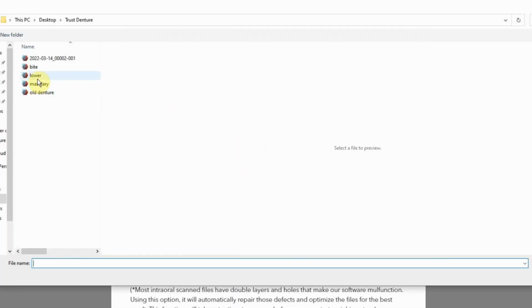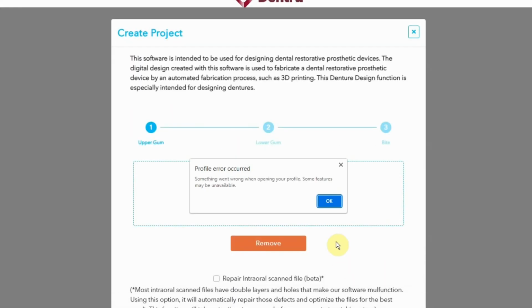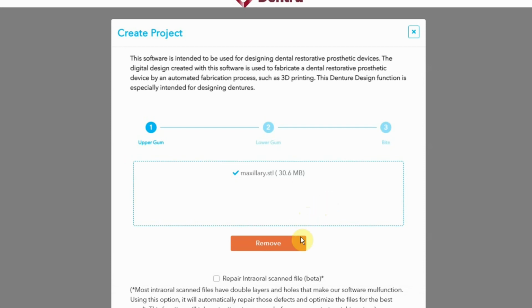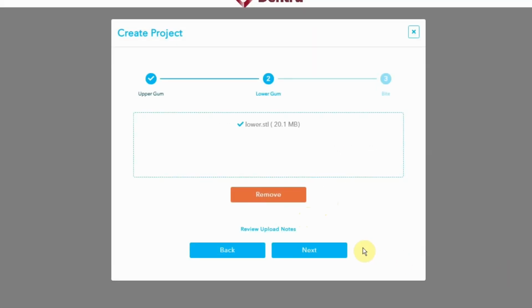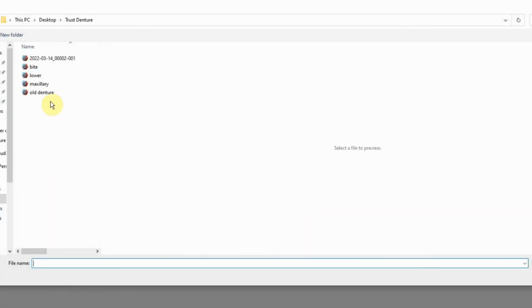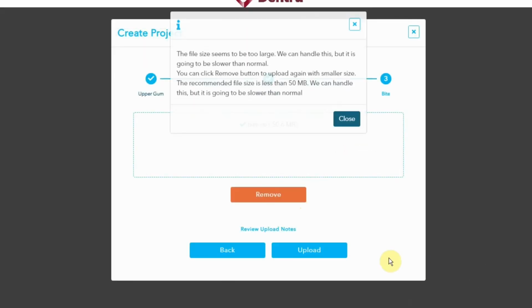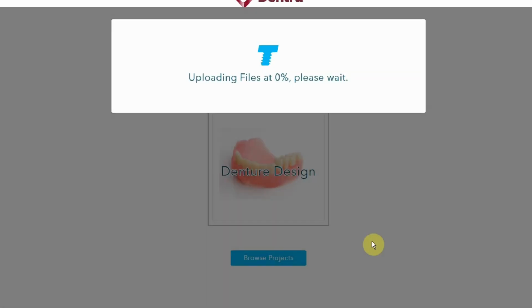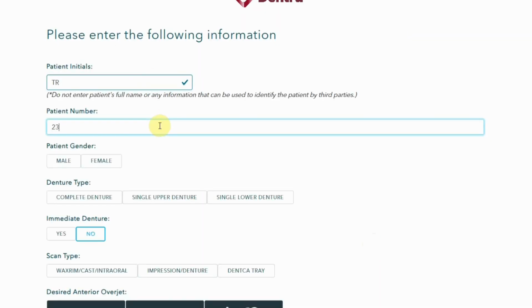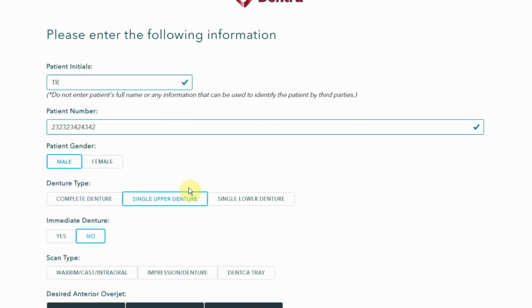And so what you do is you go to the denture software suite. And by the way, this is downloadable, but it's cloud-based. And then you're going to upload your final impression scans. In this case, I'm doing a maxillary denture, and I'm going to upload the antagonist and also the bite scan. If you don't have a bite scan, it's easy to create by exporting the scene of the articulated arches.